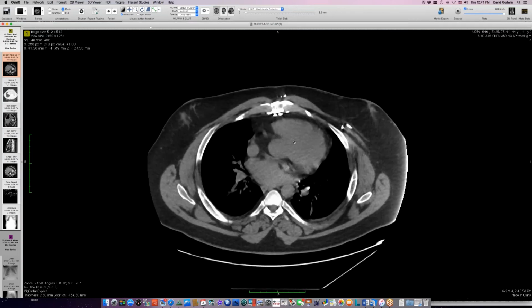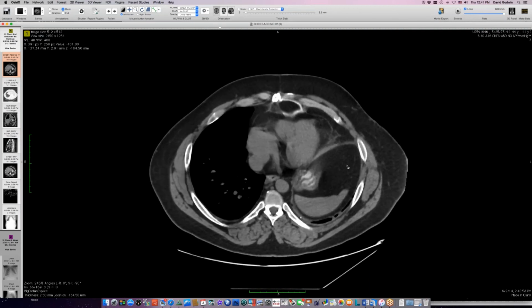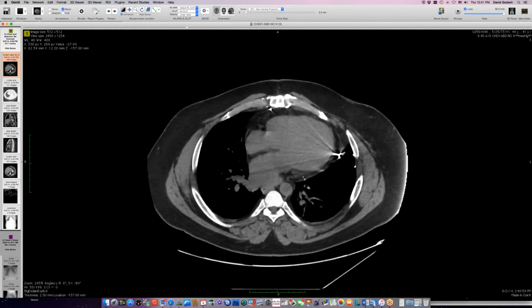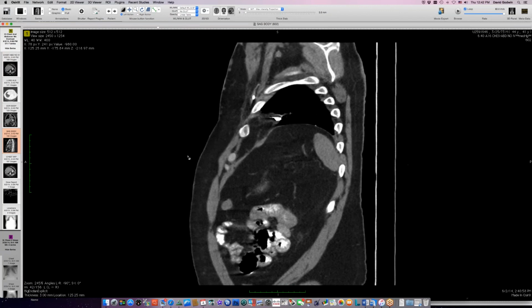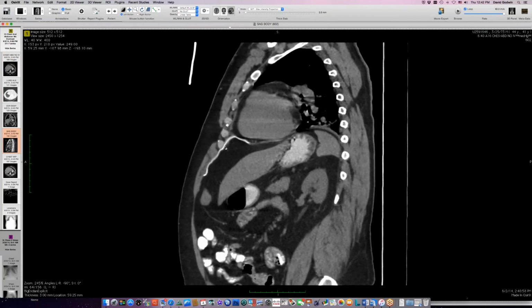Okay, I think this is another LVAD problem. No, see, this fellow did have an LVAD, then had a heart transplant. He'd had several surgeries and it was extremely difficult to section. And they ended up repairing his anterior diaphragm after carving through a lot of scar tissue with this big piece of mesh here.